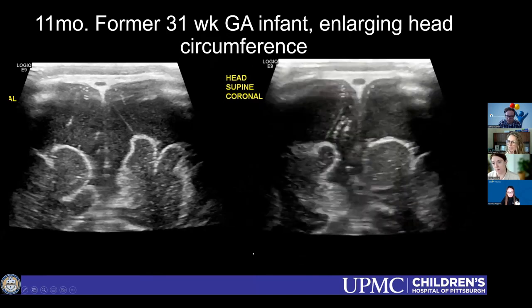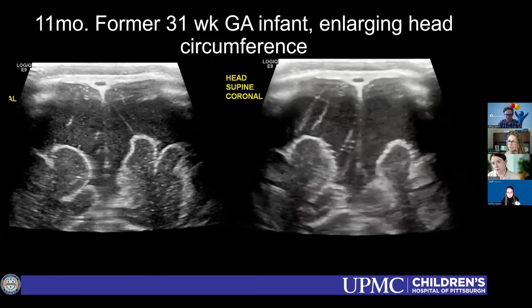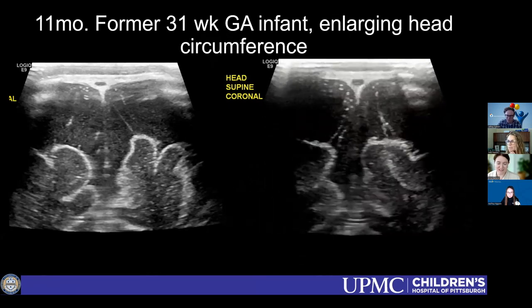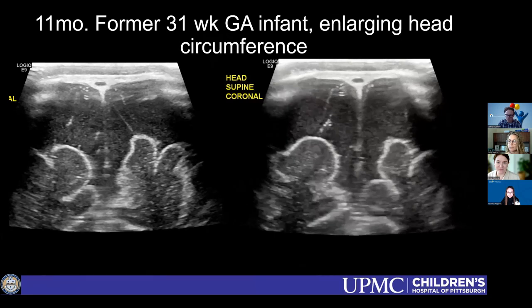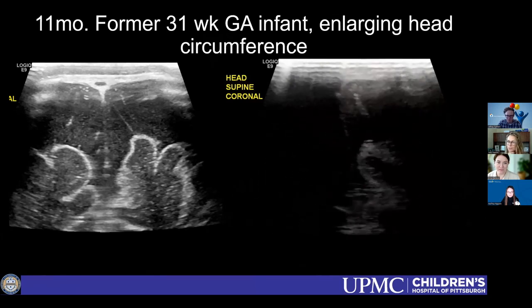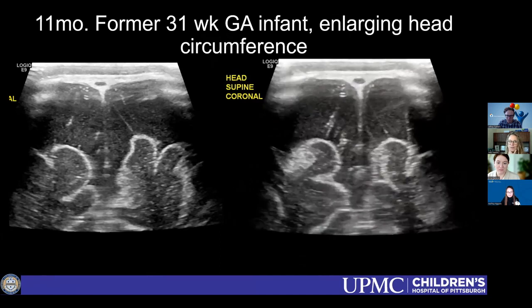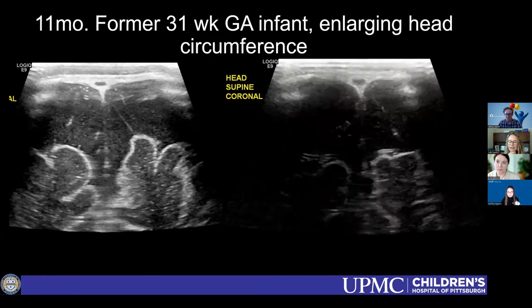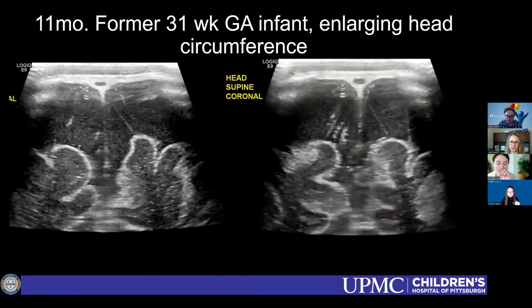And then going back to some other example, this companion case where these extraaxial spaces are, oh my gosh, big. And sometimes I think we forget to look at the history. So if it's a super premature kid, maybe with neurodevelopmental delay, don't call it benign macrocrania if it's a patient who maybe has atrophy instead. You have to have history for that.